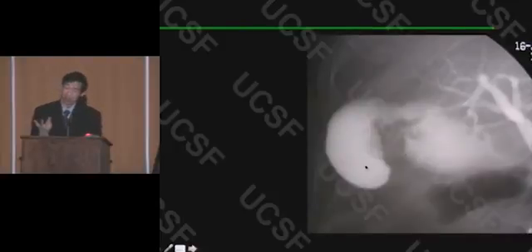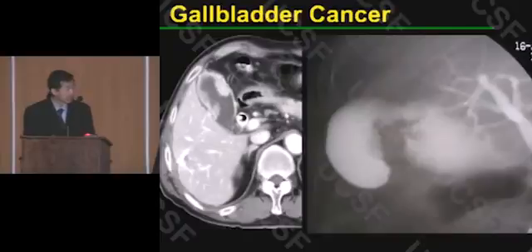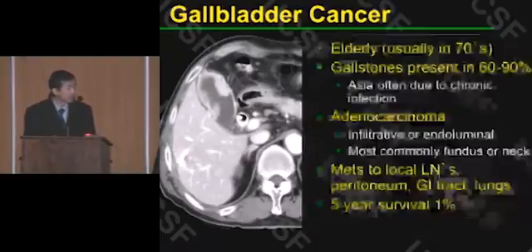That's not a gallstone. So you have to be concerned that there is a growing mass, either a metastasis or a primary tumor. This is a gallbladder cancer involving the gallbladder wall. It's very irregular, and usually at the time of diagnosis, there'll be lymph nodes and distant spread with liver invasion.